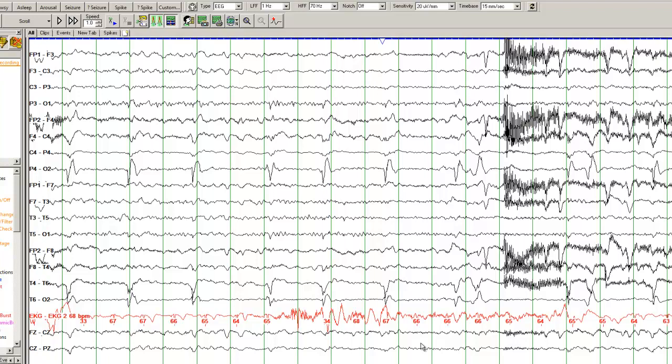Now let me show you a typical EEG here. This is an EEG from a patient with herpes encephalitis. So this is an 80-year-old man who presented with new onset seizures. His wife reported that for the past few days he had been very confused and disoriented. He was having trouble carrying out work at home and was having difficulty even feeding himself and bathing himself. And then the seizure occurred, and that's why he was brought into the emergency room.